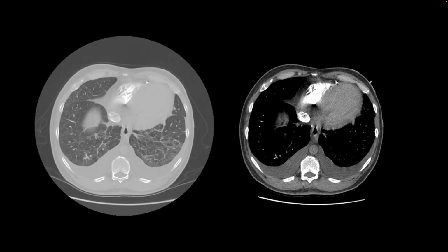Next patient. Frequently, when we read CT of the abdomen and pelvis, the lung bases are in the field of view and they may show some pathology. So here we find that the left ventricle is dilated, the left ventricular myocardium is thin, there are bilateral small pleural effusions, and in the lung windows we see these joining web-like lines consistent with interlobular septal thickening consistent with interstitial pulmonary edema. So putting all of these together, this patient has congestive cardiac failure.